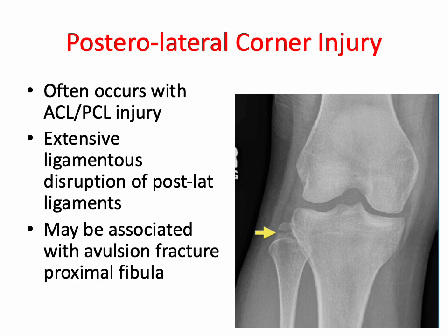They're important injuries as there's the potential for long-term joint instability if they're not identified and treated. MRI would usually be involved in further assessment of these lesions to review soft tissue structures that have been damaged. On plain films, things to look out for that should raise concern for posterolateral corner injuries are Segond fractures, avulsion fractures of the iliotibial band, and fractures of the anteromedial tibial plateau and femoral condyle.